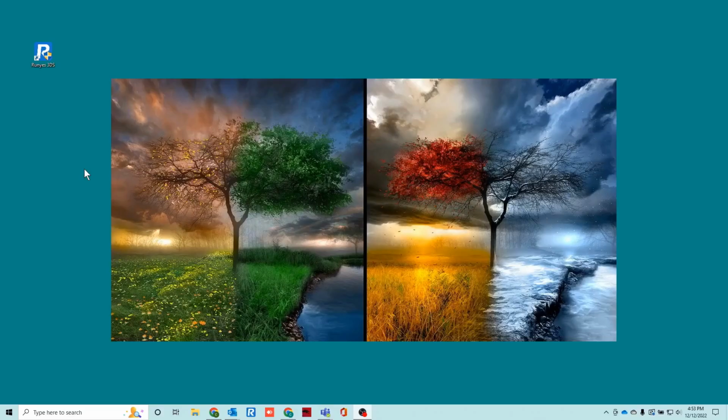Hello, in this video I'll be showing you how to use the QuickScanIOS software. So on your desktop, look for the R icon that says Runyes 3DS. Double click on it and allow the application to open.